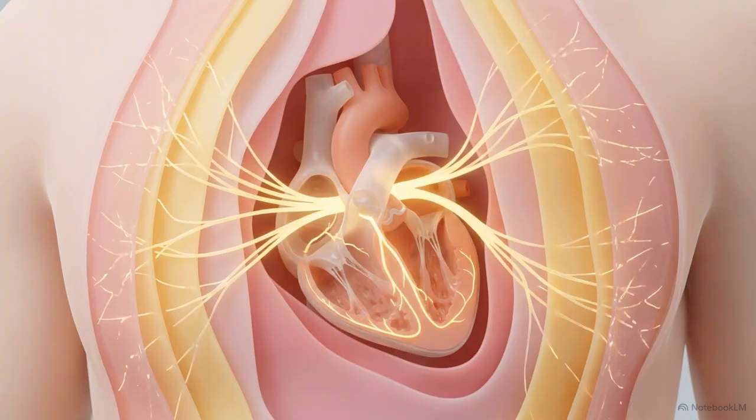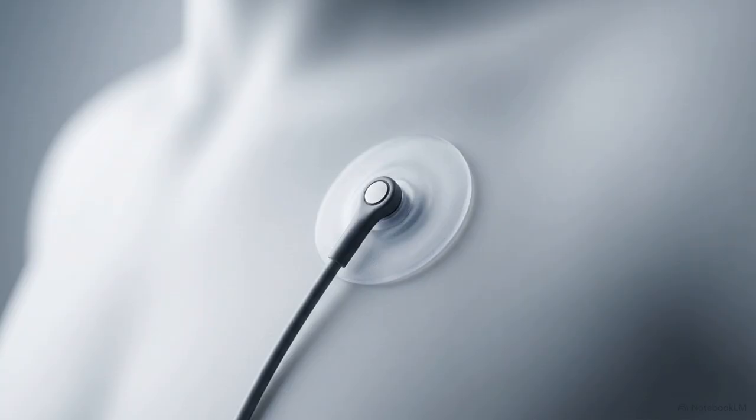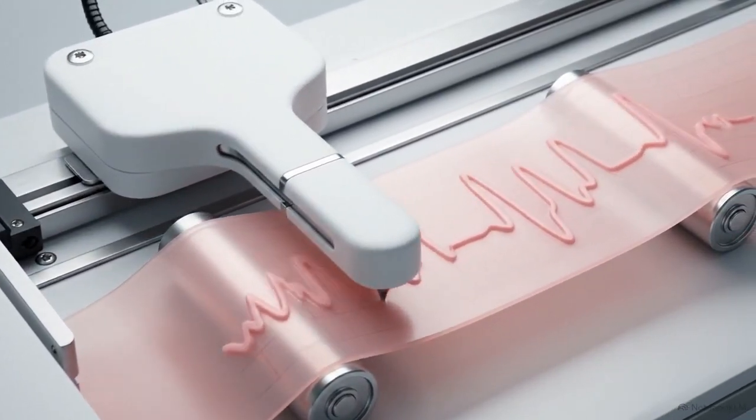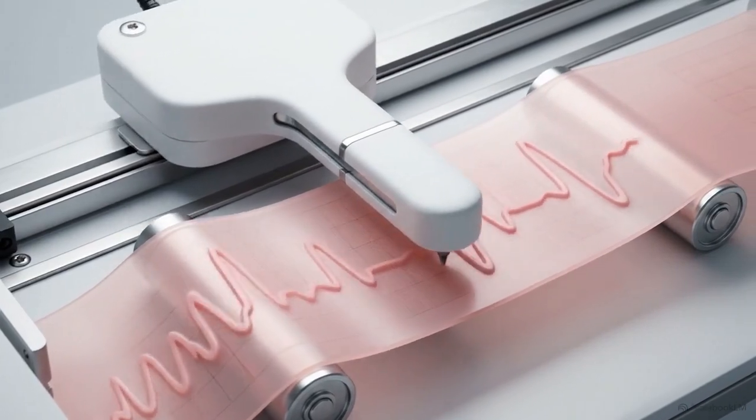Because human tissue offers resistance, the currents reaching the surface are incredibly faint. An ECG machine operates as a sensitive amplifier, detecting these microsignals across the skin and magnifying them for analysis. The resulting clinical graph is an exercise in pure physics, a direct plotting of physiological voltage against time.